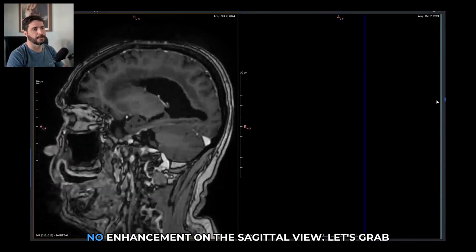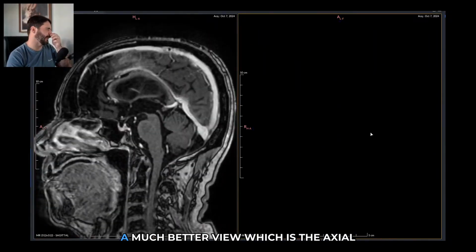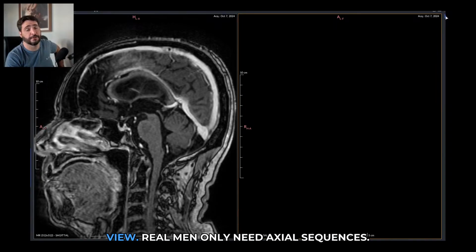No enhancement on the sagittal view. Let's grab a much better view, which is the axial view.